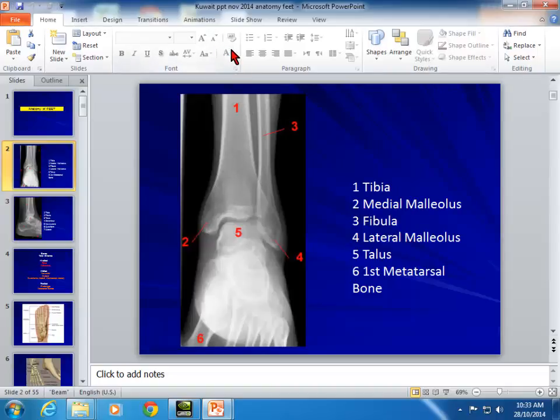If you go up towards the hip joint, it becomes exactly the same, the physis and the metaphysis, and then joins with the diaphysis. So the diaphysis, when I say, is the shaft of whatever the long bone is, and the expanded end becomes the metaphysis. So this is the medial malleolus. The fibula comes down, becomes expanded, and becomes the lateral malleolus. The medial malleolus and the lateral malleolus articulate with the talus.